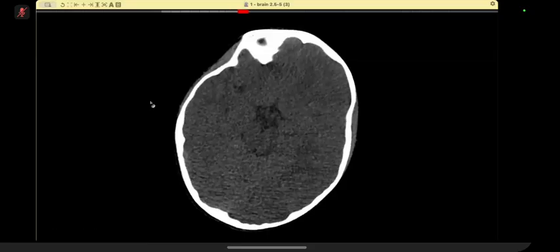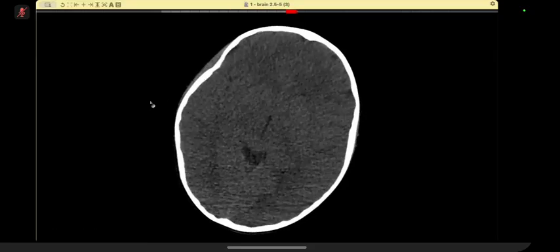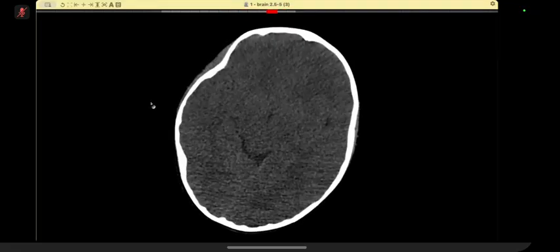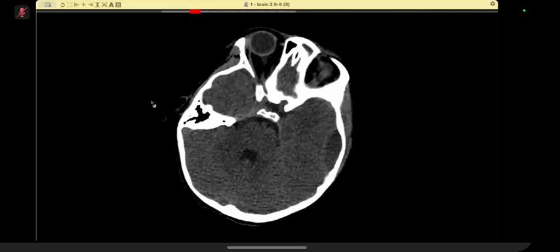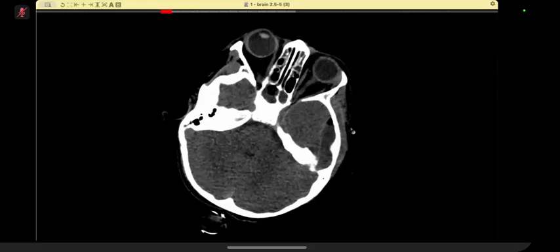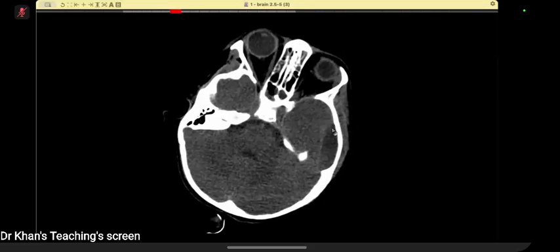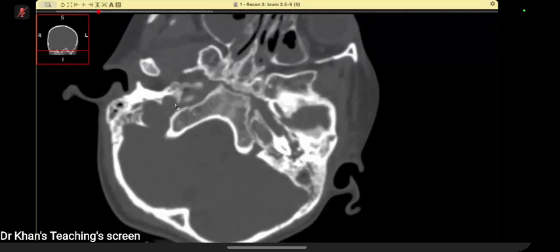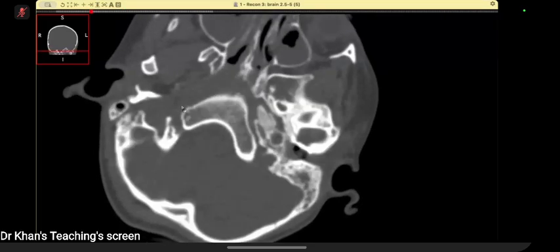Candidate 3, one thing, just like the previous candidate, you should have asked for a plain, soft tissue window, right? Yeah. And you can see, though you had picked up the finding, you would be more confident that there is an abscess. So, as a rule, ask for soft tissue window, and then everything else you did was fine.